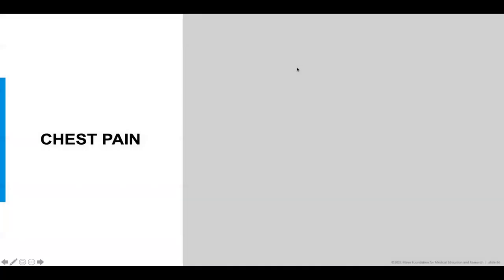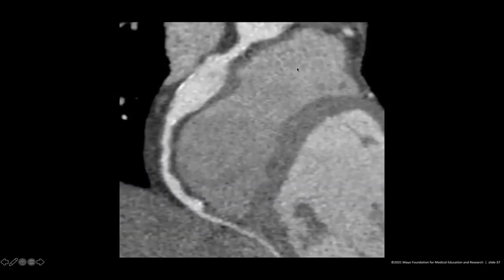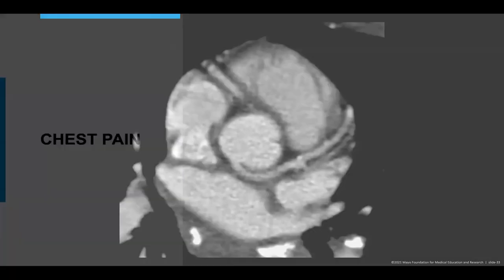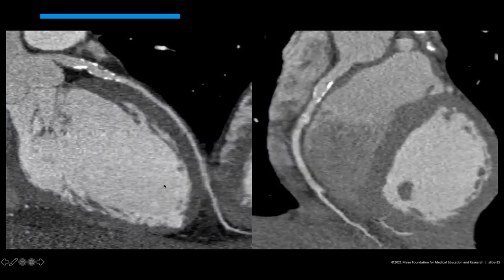Thank you. We actually have several questions coming in. On the last case, there was a question: on the case you just had up, is there a left ventricular apical aneurysm as well? I think they're talking about down here. Good question. In this case, I would just say that it's thin, and the apex can be thin like this. It's just part of the normal range.